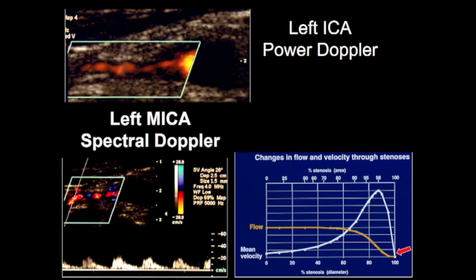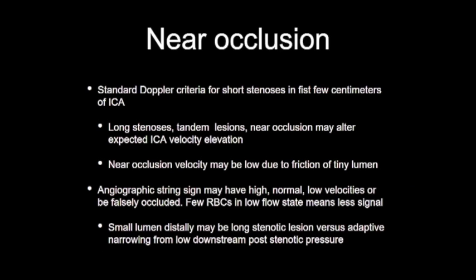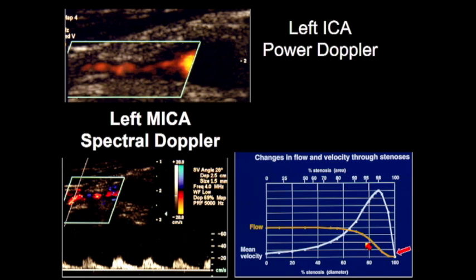If you saw the musculoskeletal section, it was very much what happens to nerves, right? The nerves swell up, and then distally they get all shrunken. So the vessel is small, and our angiographers call that adaptive narrowing. So it could be that it's actually a shorter stenosis, but it's got no pressure, or it can be that it's a long stenosis. Those are your two options. It doesn't matter. They're near occlusions, and they are associated with kind of the end of the line for these patients. Okay.